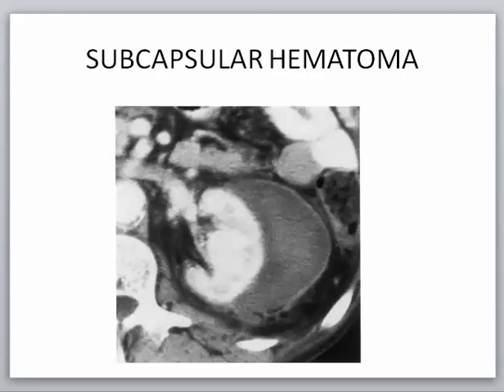But the similar thing is the hematoma also. Subcapsular hematoma is usually confined to the capsule, forming or confined to the shape of the kidney. This is subcapsular hematoma.